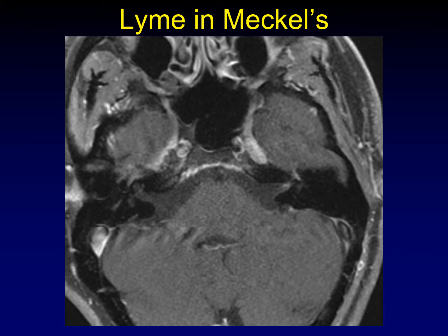Here's Lyme disease in Meckel's cave. This is the unaffected side. You can see appropriately filled with CSF. Here's the affected side, inappropriately filled with enhancing soft tissue. It's really enhancement of the nerve itself. You can actually see other cranial nerves involved here as well. Yeah, so it looks just like all of the other ones.